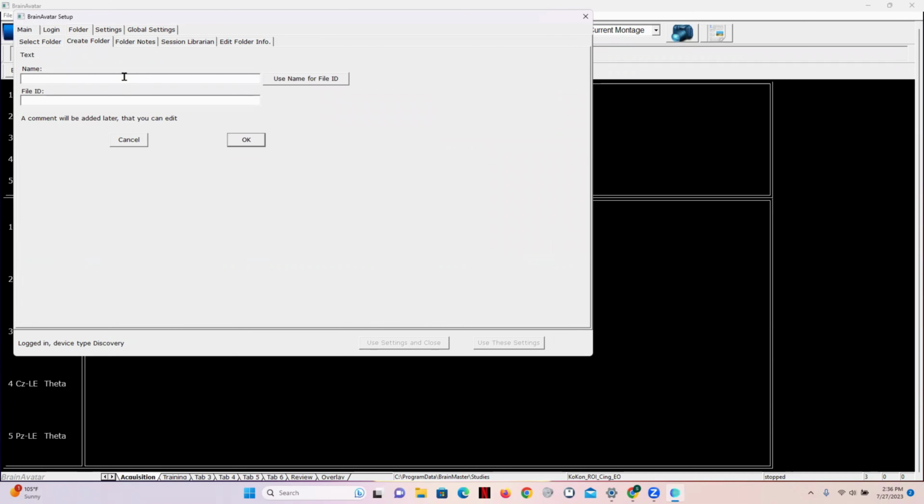We're going to put the name in. At our clinic, we begin with the first 2 letters of the first name, the first 3 letters of the last name. So I'll use myself as an example. So we will be putting in K-A for Kathy, H-E-N for Hendrix. We will do an underscore. This is a single channel protocol, so we will put the site that we will be training. In this case, we will choose F3.